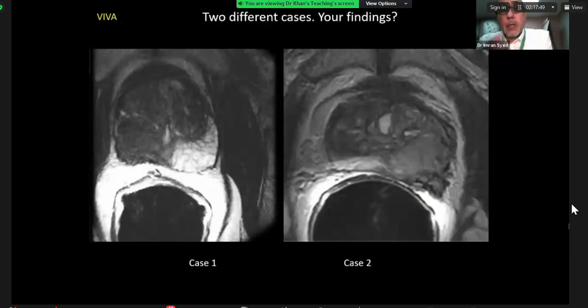The apex is referring to the bottom of the prostate, and here we've got a large amount of the prostate seen, and therefore this is at the higher end of the prostate, and therefore this is still the base. So a serrated nodular margin, which is contiguous with a soft tissue lesion seen within the peripheral zone. But I can't see the linear pericapsular striations that we've described before for tumoral extension beyond the capsule. So possible, but a serrated nodular margin, which is close.